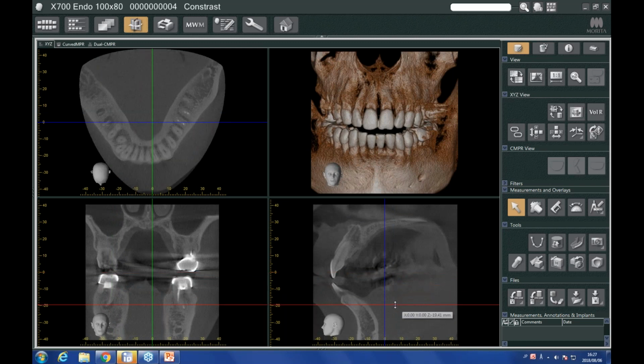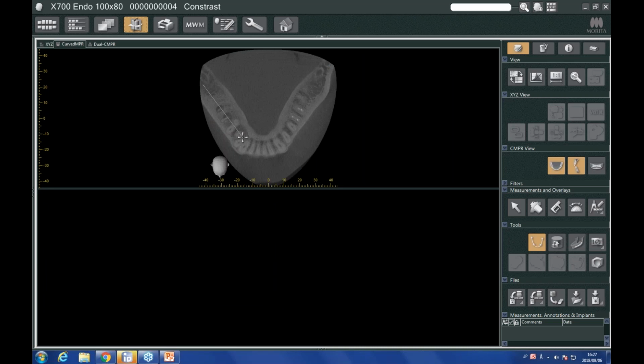So working on the mandible, if I'm going to do a presentation, say for example for the patient or for the insurance companies, I can use the printing software within our iDixel imaging suite to give a radiological report on this particular volume. In many cases, we need that for insurance, or we need to do that to explain to the government why we took a particular volume. So this way we can set up templates within our printing software and then just generate that report at any time. So I'm going to use my spline tool to draw a spline again.